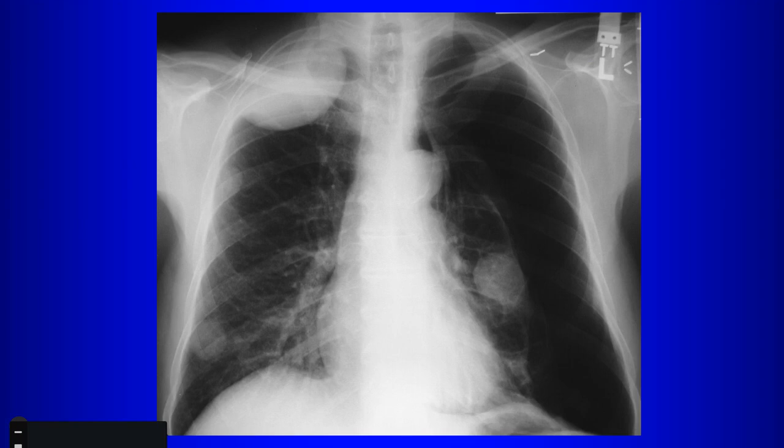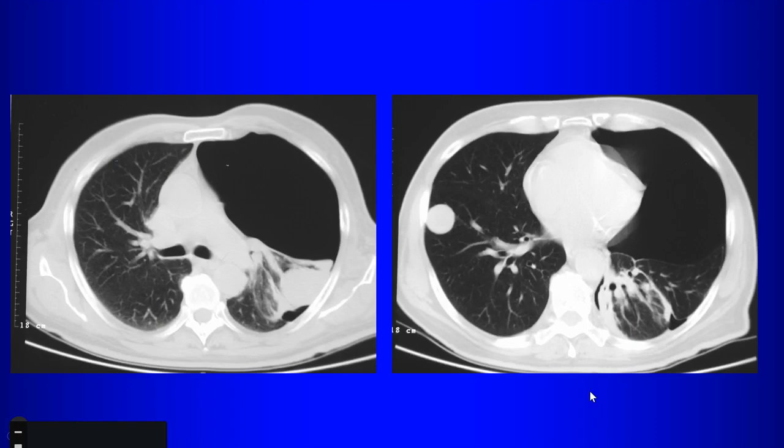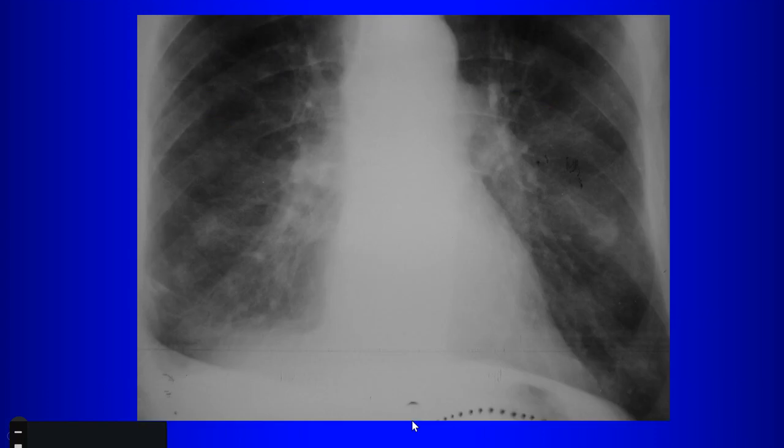You have a thought? What? Yeah, osteosarcoma, any sarcoma, but osteosarcoma particularly. So osteosarcoma metastases can be associated with pneumothorax. Sarcoma metastases also can be associated with pneumothorax. And so there's a pneumothorax, there's a tumor. There's another peculiar thing about sarcoma metastases: they tend to be very well rounded, very well circumscribed. So sarcoma metastases tend to look like marbles. They're very smooth borders, very rounded.